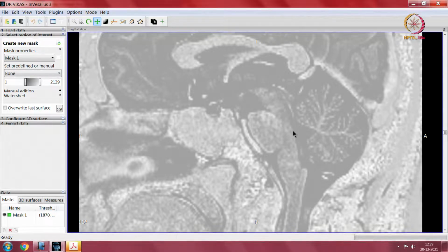So, floor of the fourth ventricle, I took some time to explain how it is rhomboid in structure. Then there is the roof of the fourth ventricle which is formed by the cerebellum. So, this is the V shaped roof of the fourth ventricle, this is the fourth ventricle, and this is the foramen of Magendie in the midline. So, this is midline. So many things in the midline which we did not see in any of the other sections. So, this is corpus callosum, fornix, midbrain, pons, medulla with the pyramid, and this is the spinal cord.